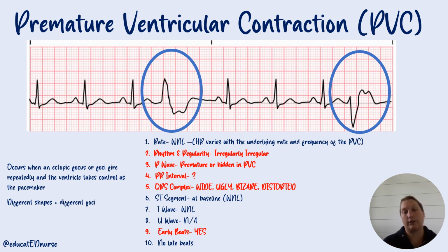When we really get worried about PVCs is when there's 3 of them in a row. Okay, three of these PVCs in a row. The patient is at high risk of going into Vtach, because then the atria aren't beating, and somewhere in the ventricle there's some irritable site that's firing, and the patient can go off into Vtach. So that is a concern.